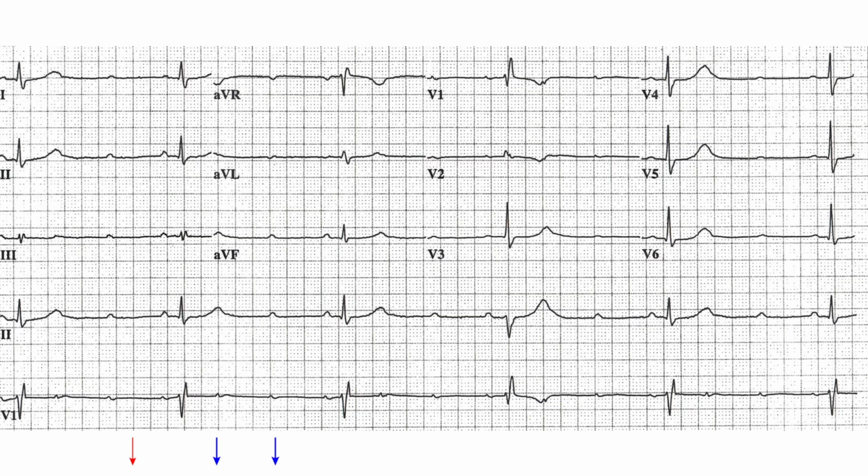Okay, so what do we have here, right? You got your P wave, you got your P wave, you got your P wave, and finally we get a QRS, right? Let me put D for depolarization on here. And then you get your P wave, right? D for depolarization, so on and so forth. And it's no different over here, except look at lead 2, right? Lead 2, the mean vector of this is going towards lead 2, and then here it reverses.